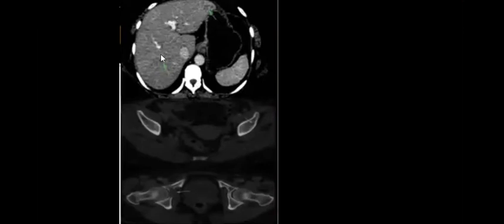No, it's not. Especially after you look at the rest of the images of this patient, you can see that even the liver of this patient has multiple lesions. So this patient already has liver lesions. And this is also one of the good things about PET-CT: if you just look at the CT, maybe you can suspect that there is a hypodense lesion here and here, but you cannot imagine that it will have this very high uptake and reach all this extension, right? So that's the importance.